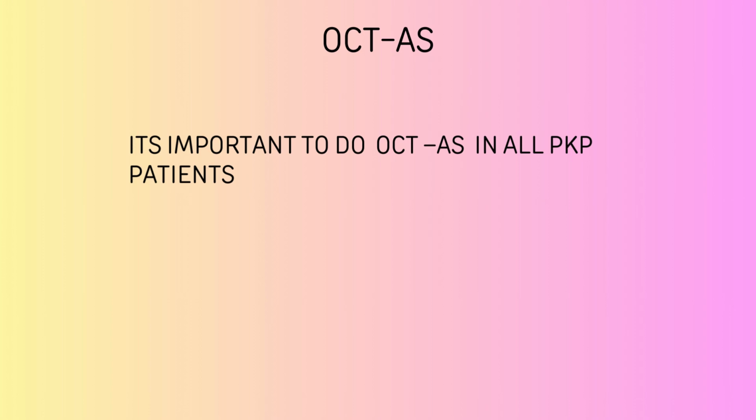It shows us the importance of OCT anterior segment, how important it is to calculate anterior chamber depth, host and graft junctions, anterior chamber angles, and any synechiae formation. All this information can be gained with OCT anterior segment, and it should be done routinely in post PKP patients.